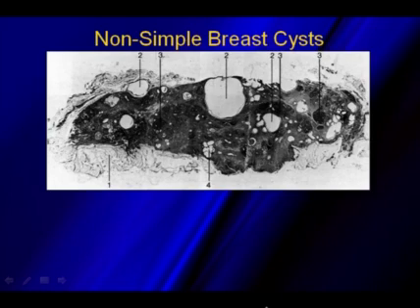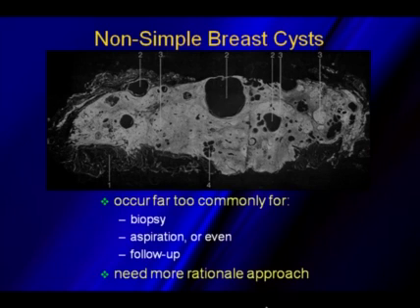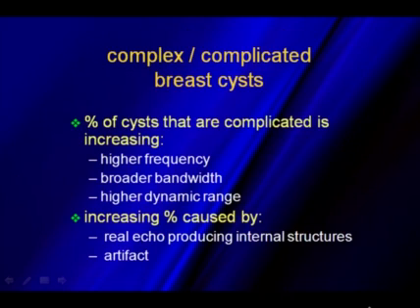Now, non-simple breast cysts, they are so common. We take this pathology specimen, invert the image of it. They occur way too commonly for us to biopsy any of these or even aspirate them. If we were doing that, we would be following up every cyst or aspirating every cyst that comes through the department. We need more of a rational approach on how to evaluate non-simple breast cysts with sonography.